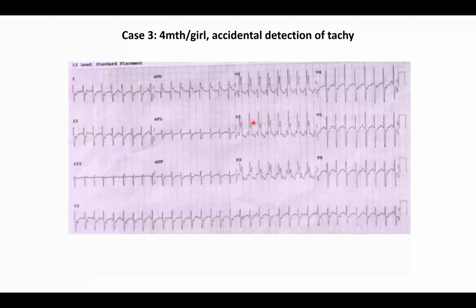This is not an intracardiac EGM, it is just a surface ECG. This was a 4-month-old girl, accidental detection of tachycardia, no symptoms. This is the only rhythm. The patient had some upper respiratory tract infection, the rate was fast, she was asked to do an ECG and sent to us.